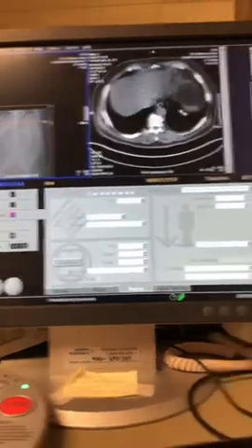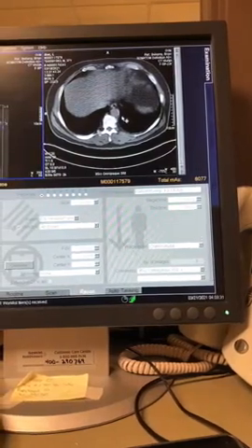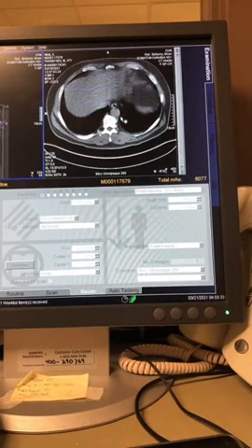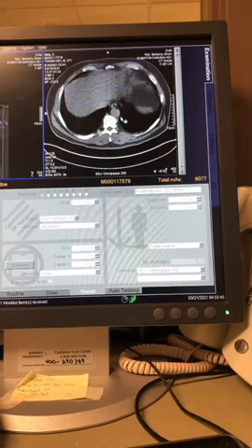But look at our premonitoring slice. This is what matters. It's the descending aorta. Now, that's the same as a regular chest, right? So then what's the difference? Maybe you can guess it while I ramble for a second. The difference between a regular chest with contrast and a CT angiogram of the chest is what? Well, remember what I said in the last section: on the regular chest, we are not in the arterial phase. We're between arterial and portovenous, okay?